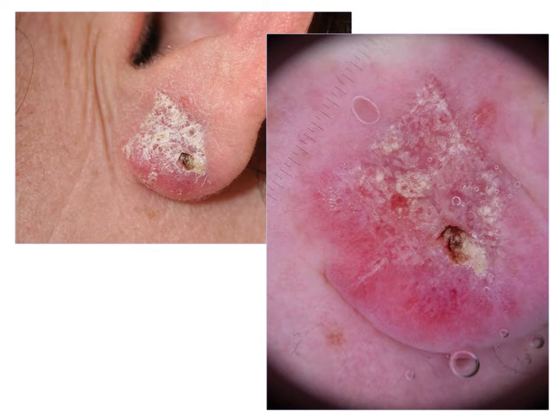And this is normal because the purpose of dermoscopy is to eliminate the reflection of light on the stratum corneum. This is why superficial squamous cell carcinomas, only composed of squames, are difficult to identify with dermoscopy, and this is why naked eye examination is often considered more important.